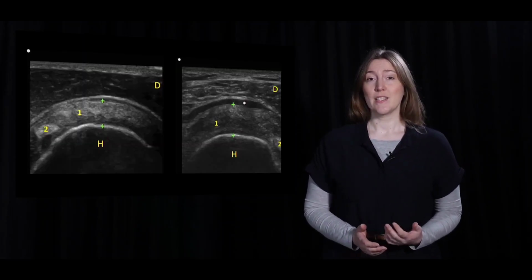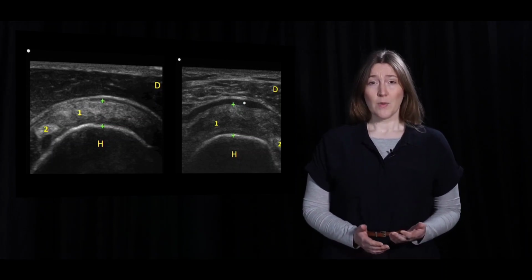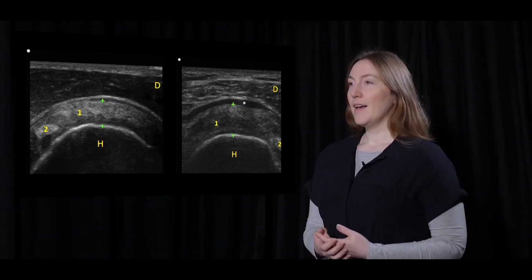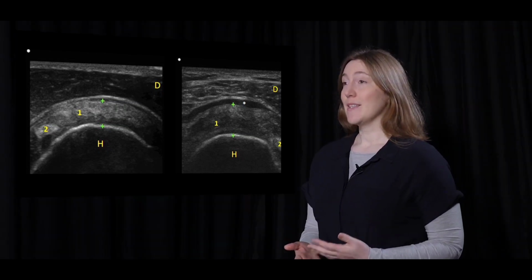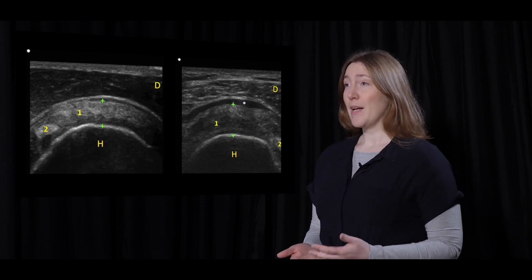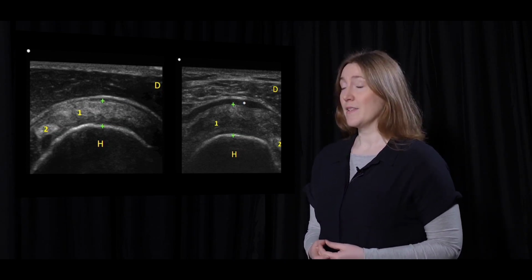This presentation is about anatomy, not pathology. I'm going to show you a few examples of a healthy bursa and a bursitis anyway. I would like to be sure that you notice that detecting a bursal problem is actually quite easy, as the bursa might not be very visible in anatomy, but in pathology it's very obvious.